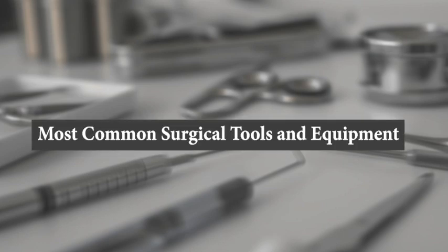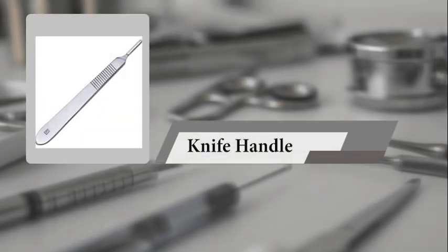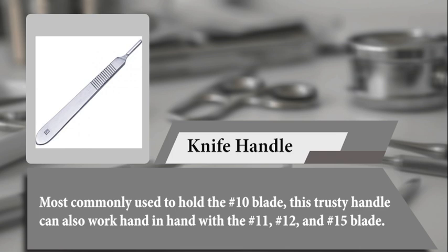Most common surgical tools and equipment. Knife handle. Most commonly used to hold the number 10 blade. This trusty handle can also work hand in hand with the number 11, number 12, and number 15 blade.